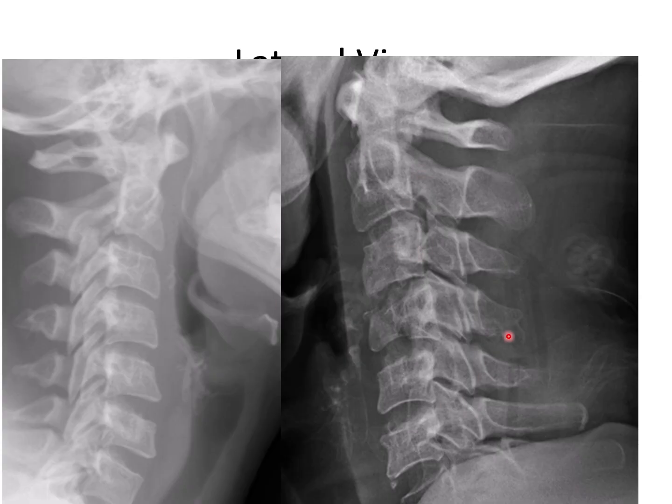What do we see in this image? Can we differentiate, or is there any pathology in the second image? There is a fracture in the C4 vertebra. As we can see, its anterior height is reduced as compared to the others. We can compare from here. Its anterior height is reduced and there is discontinuity in the cortex. So this is a fracture of the C4 vertebra.